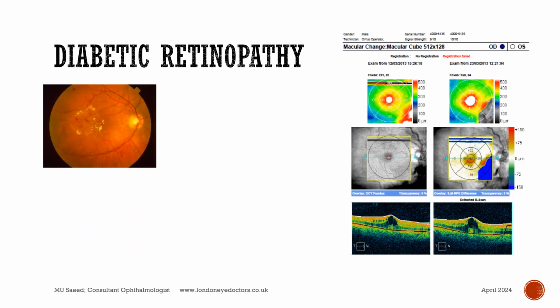Diabetic retinopathy, especially diabetic maculopathy, is a concern, and diabetic maculopathy can be quantified in terms of the macular edema with the OCT scans. This is important as in many centers and in many healthcare systems, the anti-VEGF agents and medications are rationed.